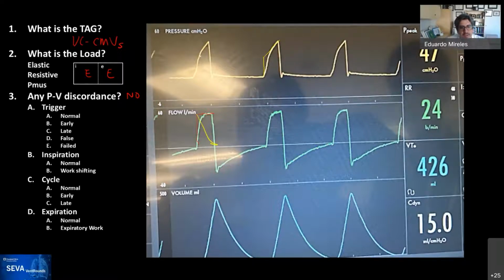That's aligned with what I'm showing you here now. So I would think that this patient likely has resistive load during inspiration and resistive load during expiration. Now, I'm a little bit evil, and I left here the dynamic compliance. You saw that. Is that what drew you to the elastic load being high? Partly, but the peak is also pretty high. Yeah, remember that the peak pressure means nothing on volume control, because it can be all resistive, or it could be compliance and resistance, right?